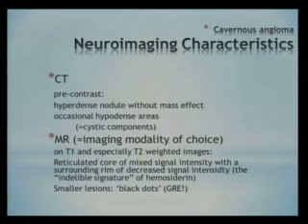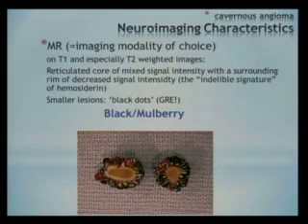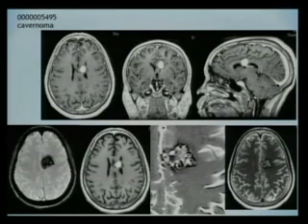On MR, the T2-weighted sequence is the best because it gives you the look of the mulberry. This is not a mulberry. I'm not trying to fool you. This is a blackberry, but I was told by the donor that it looks much like a mulberry. As you know, I don't lie. So here's the mulberry.